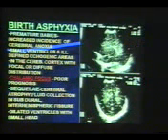Not only that, due to birth asphyxia, we can get, in the premature baby, an increased incidence of cerebral anoxia, resulting in small ventricles and ill-defined echogenic areas in the cerebral cortex with focal or diffuse distribution, known as brain edema. If we get a thalamic focus, then the prognosis is very poor.